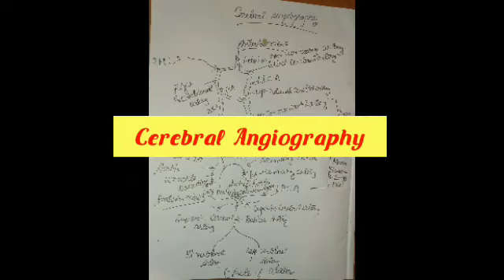Dear students, today we are going to see about the cerebral angiography topic. When we talk about angiography, what is angiography? It is the study of blood vessels. When we mention the term cerebral, that means we are going to study the blood vessels present in the cerebral, that is the skull.